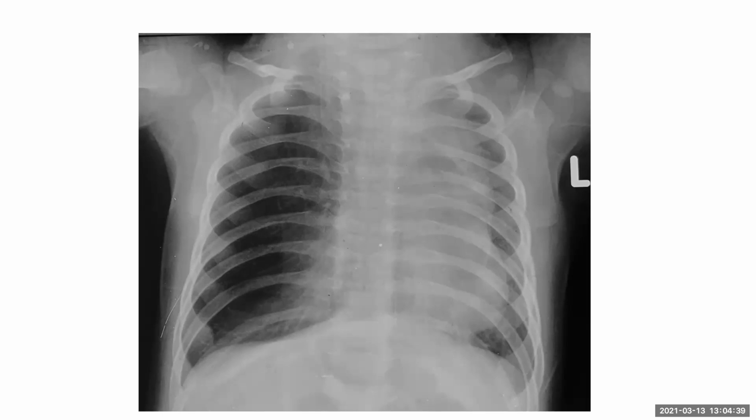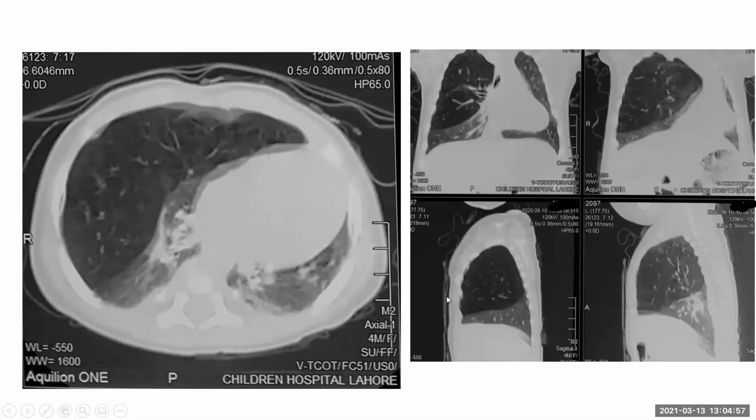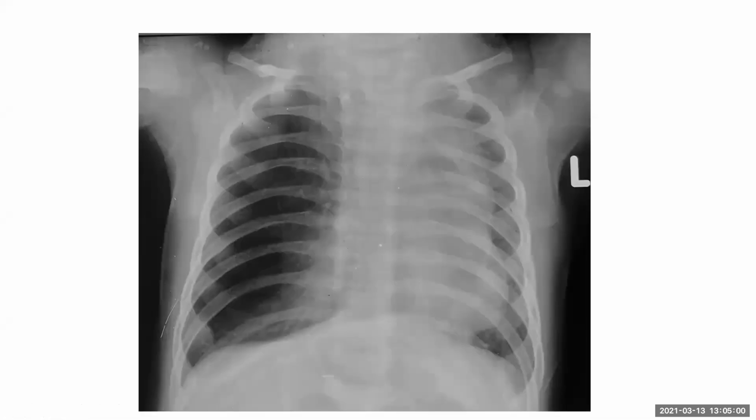It always goes to the lower lobe bronchus or to the intermedius, and then the whole lung would be hyperlucent. You won't see a part being compressed there. And I don't think there is so much mediastinal shift. I haven't yet seen so much mediastinal shift with a foreign body. It won't go to the upper lobe bronchus, which arises from the right main bronchus superiorly. The foreign body would go down.